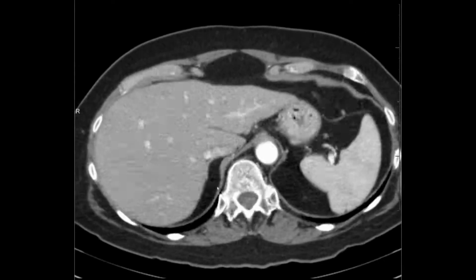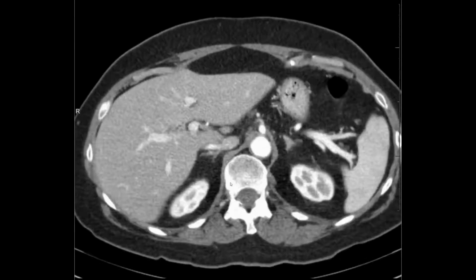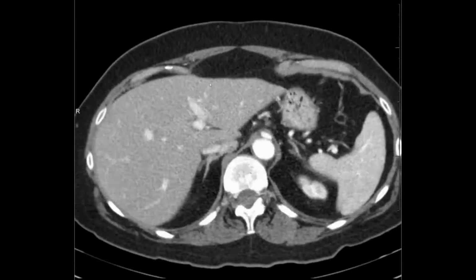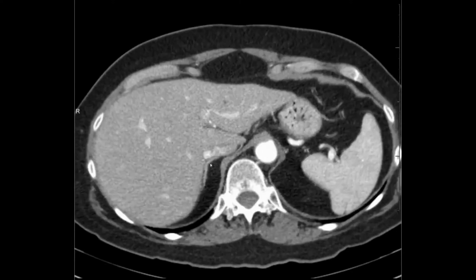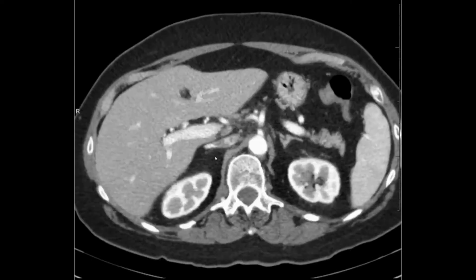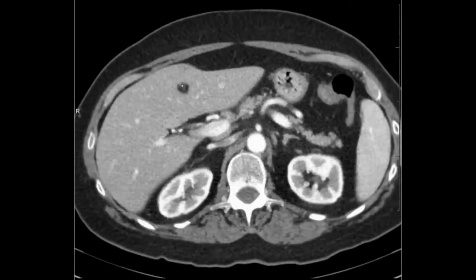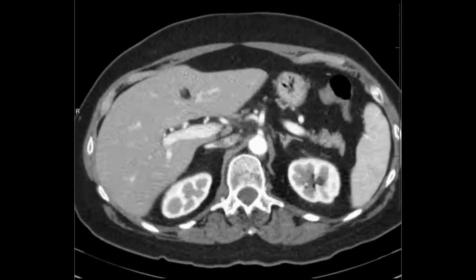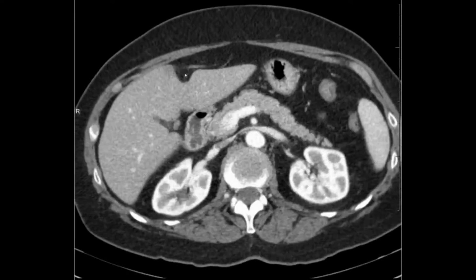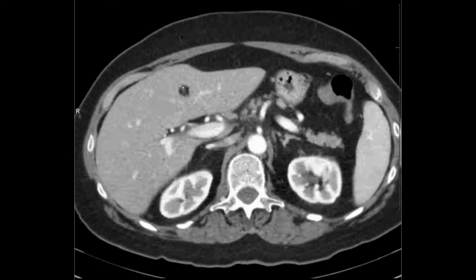And next, I want to go down into the top of the abdomen. As mentioned before, the number 1 and number 2 metastatic sites are the liver and the adrenal glands. And so in this case, I'm going to be closely evaluating the adrenal glands for anything abnormal. And then looking up here at the liver, this is likely fat because it doesn't really have mass effect. It's just kind of following it despite the fact it's low attenuation.